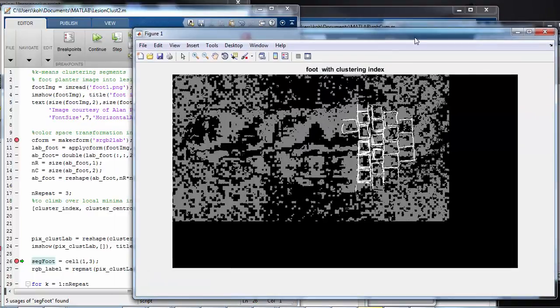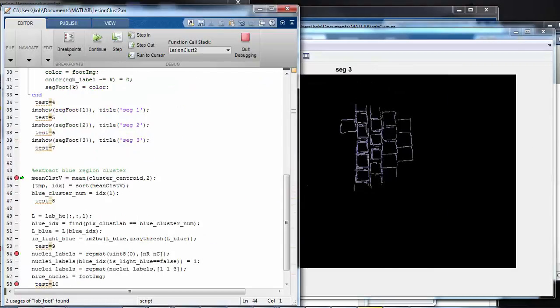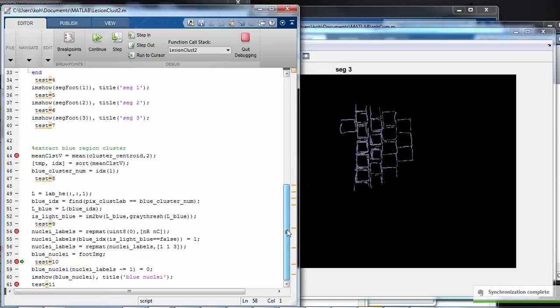So this step shows one of the clustering results, and then the blue bounding box has shown distinctly as the box and the region are clustered. And then the bounding boxes are extracted, and then the further development in the code in MATLAB will be developed.